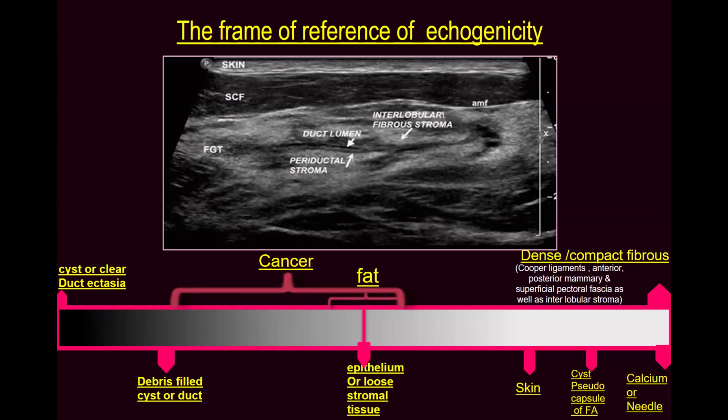But you know that there are variations in the breast. Not in all breasts can you see epithelium, and not in all breasts can you see stromal tissue. But definitely, if you review all the previous images, almost all, we could appreciate fat, at least a small or thin layer of subcutaneous fat, supposed to be detected or visualized in our ultrasound images.